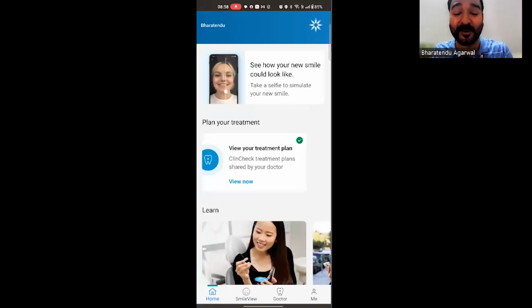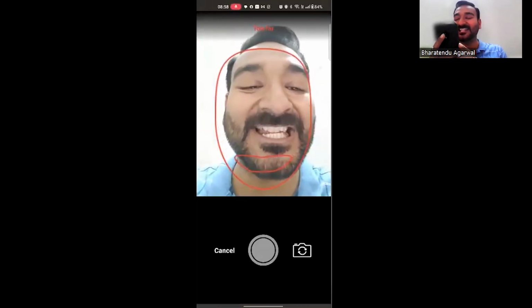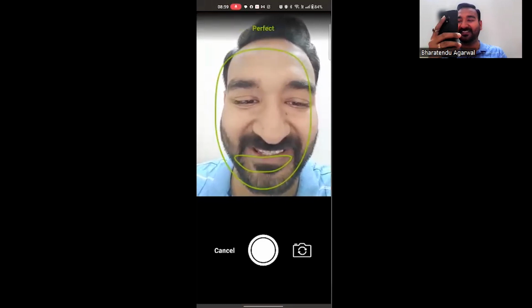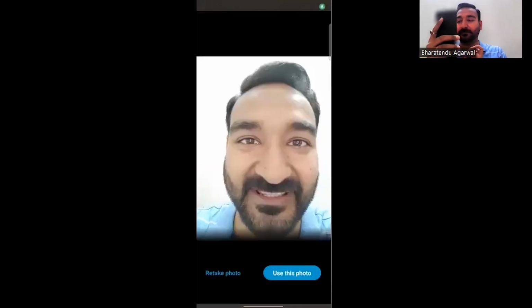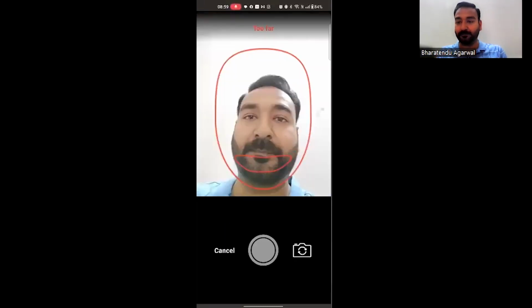And guess what? I'm already wearing the aligners today. So still, see, I'm already wearing the aligners, but it's refusing to take a picture. Yeah, I don't want to use this photo. I'm just going to leave this section and move to I'm a patient now.